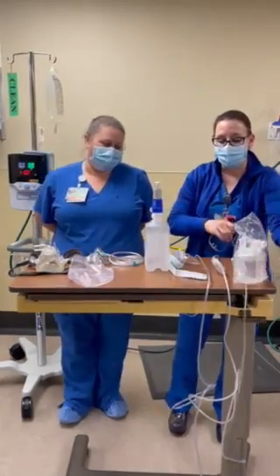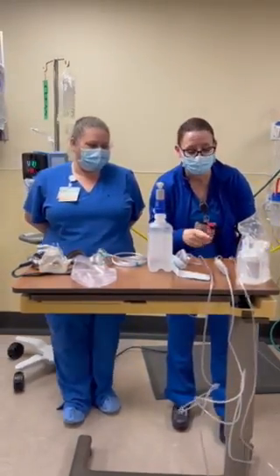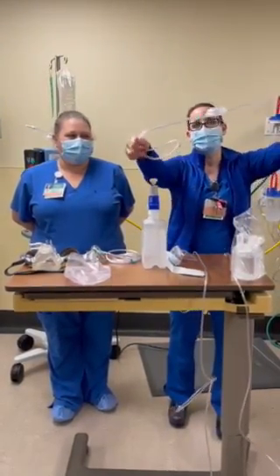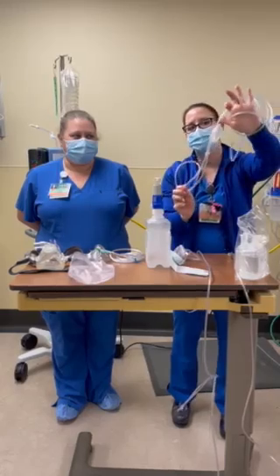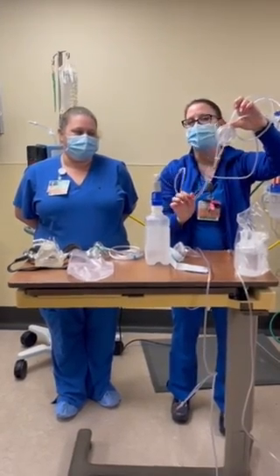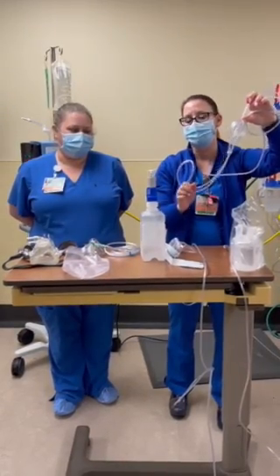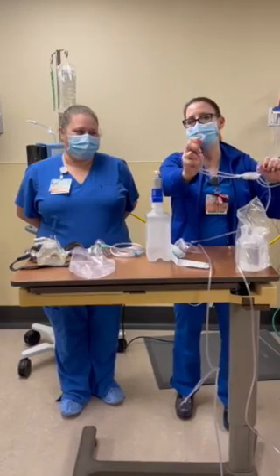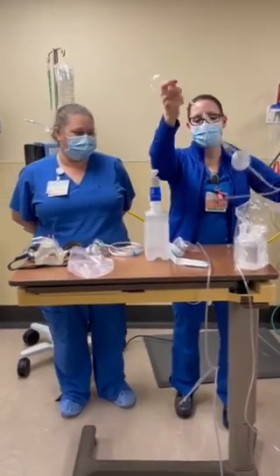Next up, if the nasal cannula is not cutting it and you need a higher liter flow than 6, you can switch to an Oxymizer. It has this little pendant in the middle that acts as a reservoir and catches some of the oxygen and kind of creates a higher FiO2 content for the patient. Right here, you see this maxes out at 10 liters per minute. No higher than that.